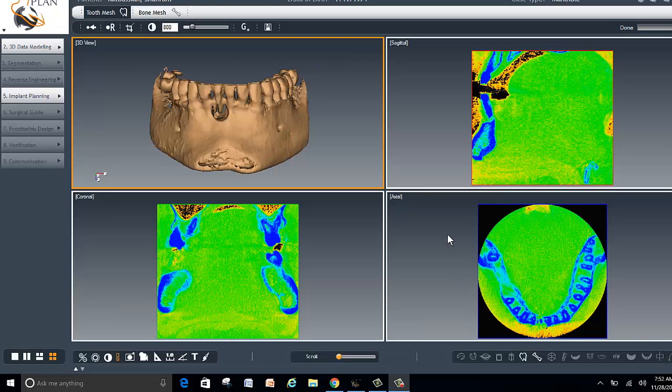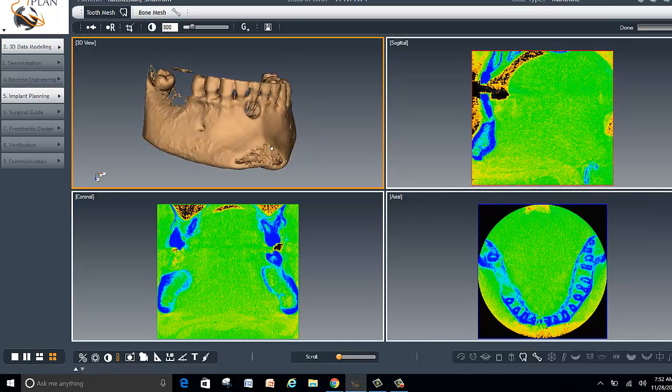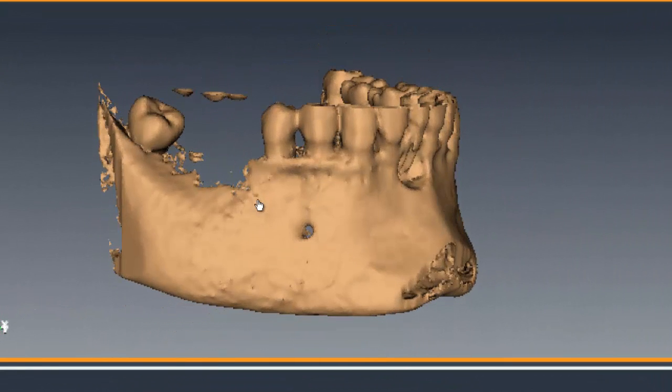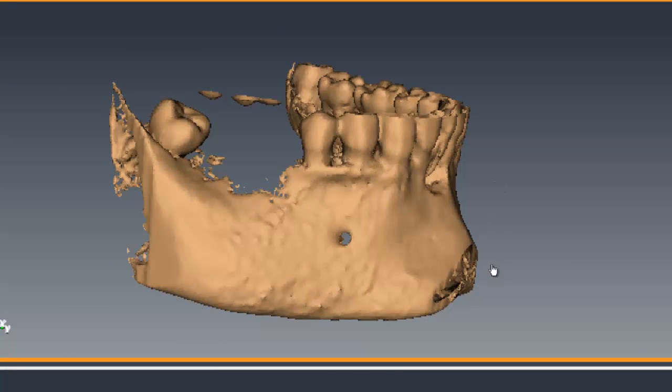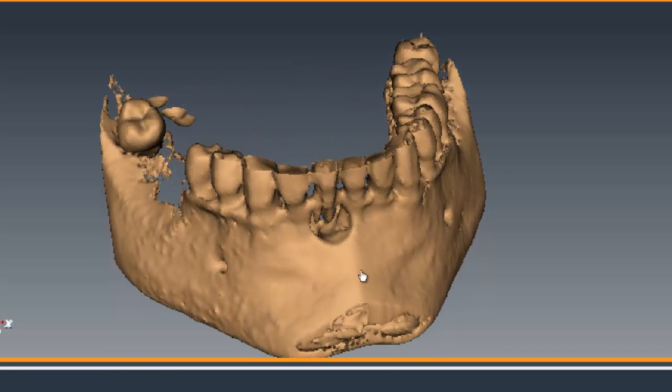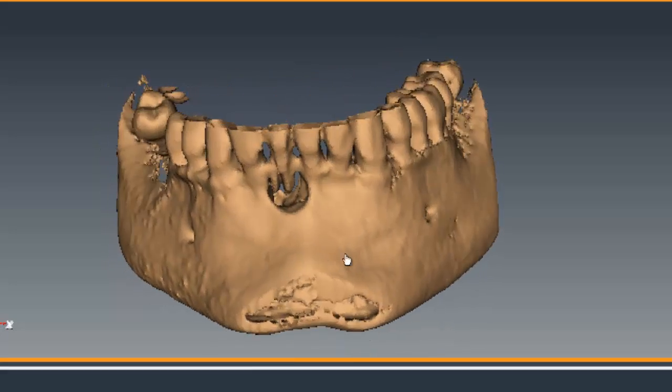This is the treatment plan for two lower mandibular implants on the molars, tooth number 30 and tooth number 31, rendering the DICOM data in 3D. Notice right here as I rotate the image that was rendered, the front chin was cut off when the scan was done.